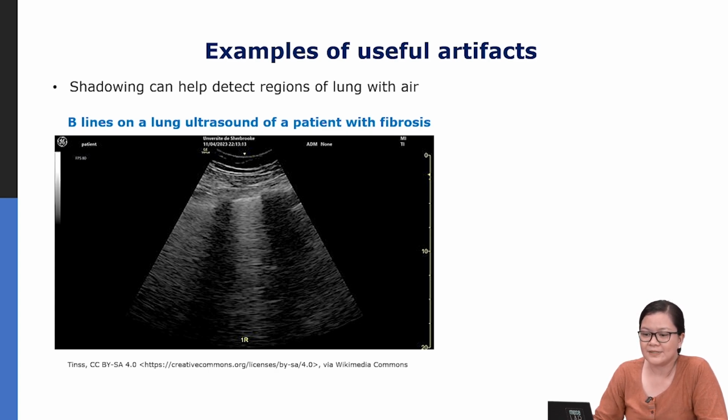What happens in this lung ultrasound is that somewhere here is the pleural line, which encases your lung. And here are regions where there is healthy lung, because lung is mostly air-filled. A healthy lung would be air-filled, so it would cause some shadowing in that lung.